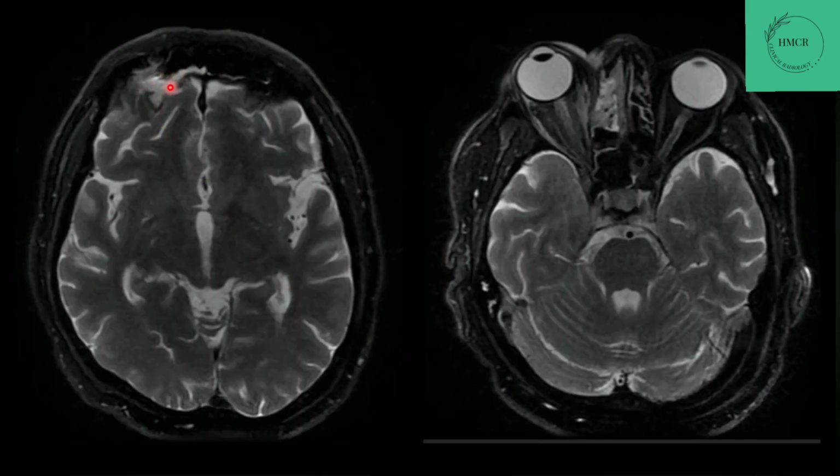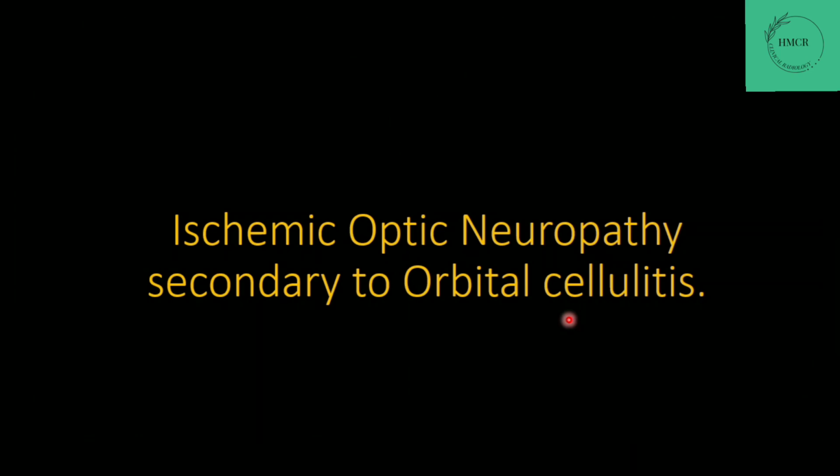Also we can see there is opacification of the right frontal sinus as well as of the ethmoid cells. So this is the typical case of ischemic optic neuropathy secondary to orbital cellulitis.